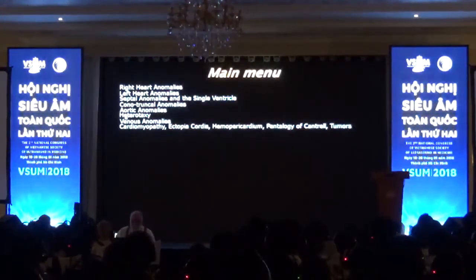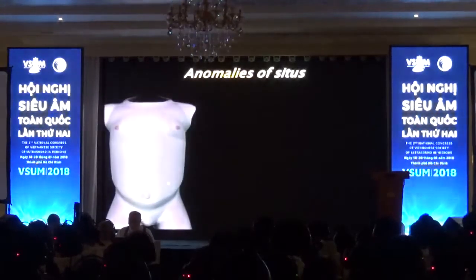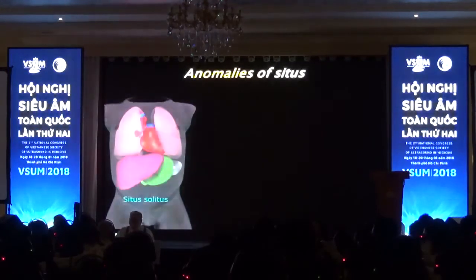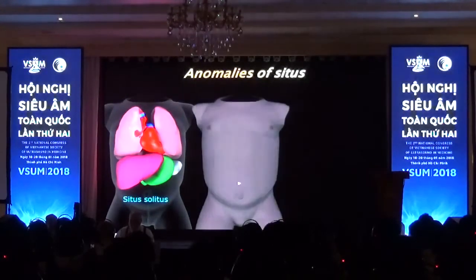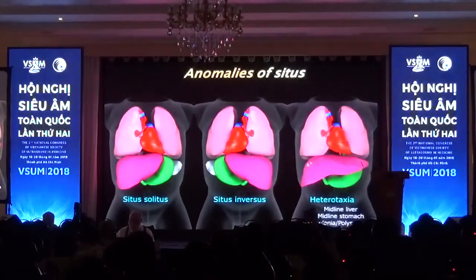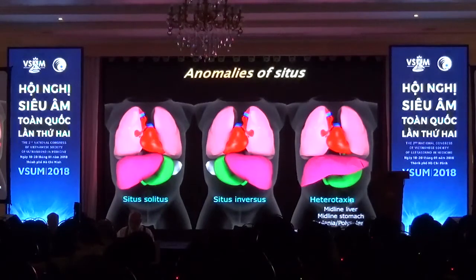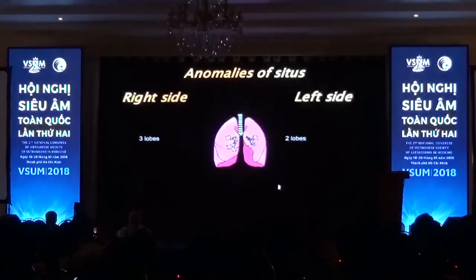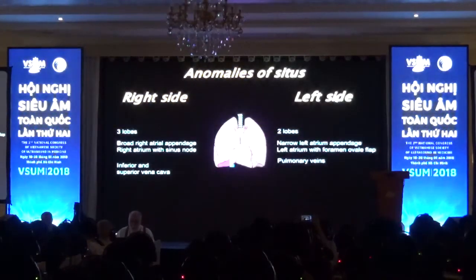And then I wanted to show you some of the heterotaxy, because we mentioned that several times yesterday, and I don't have much time, so I may have to go fast here. Compared to the normal situs solitus baby with the apex of the heart and the stomach on the left side, you also have a mirror image baby, which is situs inversus, where heart, stomach and spleen are on the right side. And then you have anomalies of situs in which the heart and the stomach may not be on the same side. You may have the liver in the middle, and this is the one in which you think about heterotaxy. Now, I'm going to skip the way to identify, but there's some way to recognize the right side from the left side.